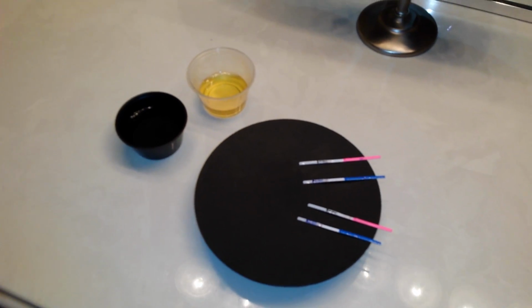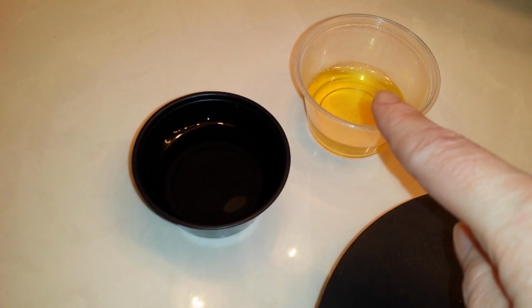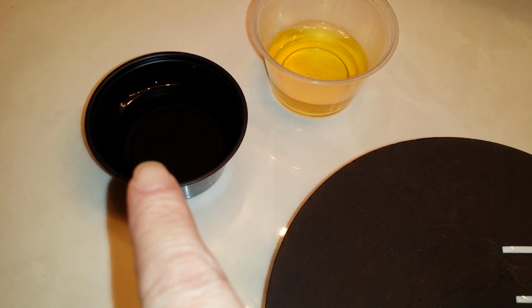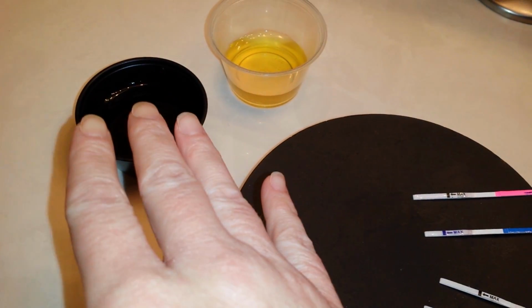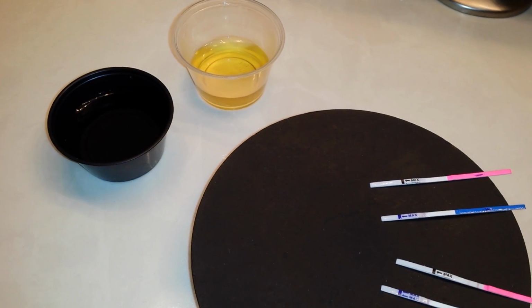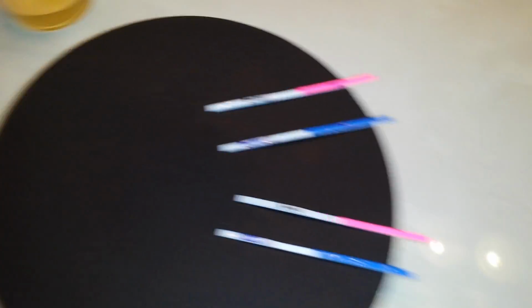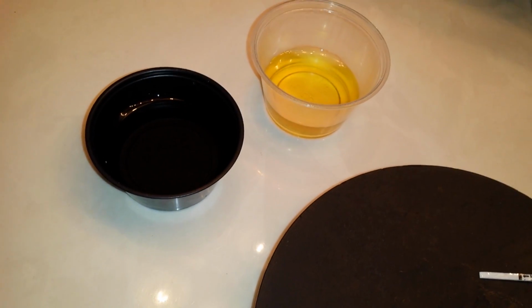So what I'm going to do today is test out these two samples here. This sample actually has HCG, and this sample is considered to be normal. Now, if it turns out to be a sample that has HCG, that's going to be a huge surprise to me because I'm on cycle day 4, so that shouldn't be the case. Also, it's a diluted sample, so I just wanted to test out the theory.